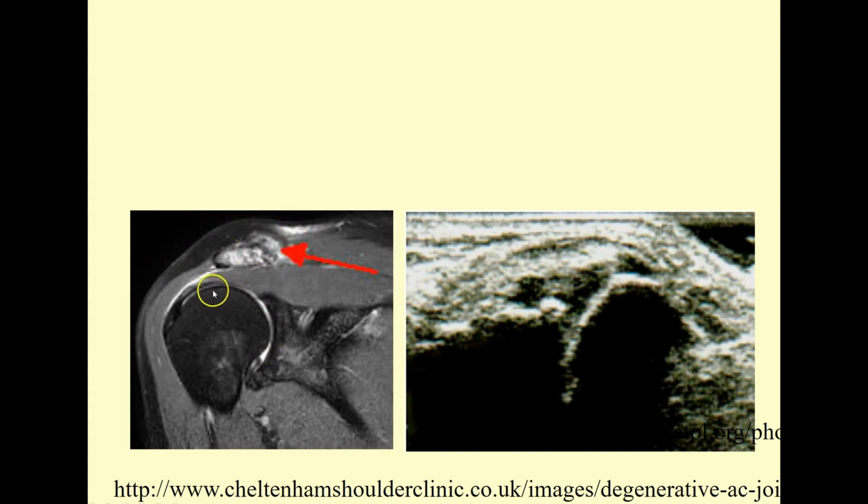Look at how nice and neat the humeral head is. Now, it is in a cephalad position versus the glenoid, so this leads me to suspect that there's rotator cuff injury. Here's the supraspinatus coming right through here to plug in on the greater tubercle and, of course, deltoid complex overlying the whole thing.